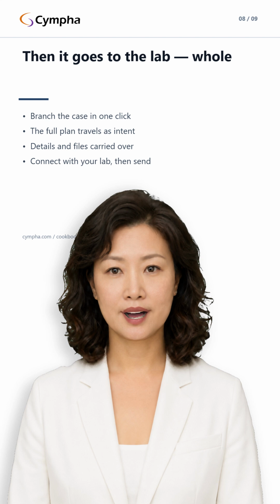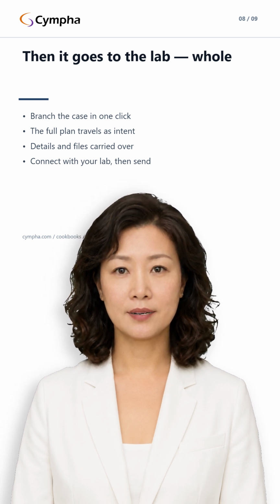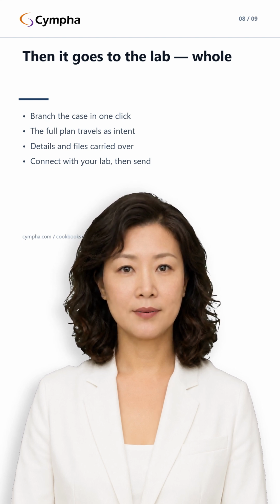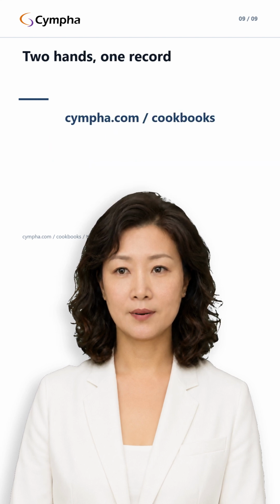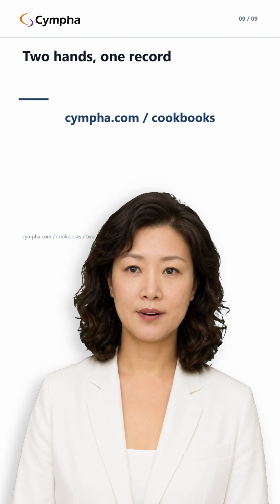If the treatment needs a lab, one click branches the case. The patient details, the files, and the doctor's full reasoning all travel with it. The lab starts from what you decided, not a one-line brief. You connect with your own lab first, then send the case their way. Fewer questions coming back. Less rework. A case that arrives already understood.